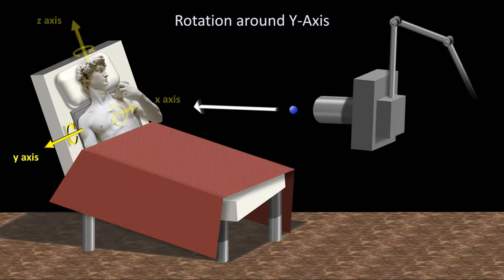It can also be due to constraints with the patient and the room. For example, if a patient is not clinically stable enough to be sat completely upright, but a piece of equipment suspended from the ceiling prevents the X-ray source from being positioned above the patient.